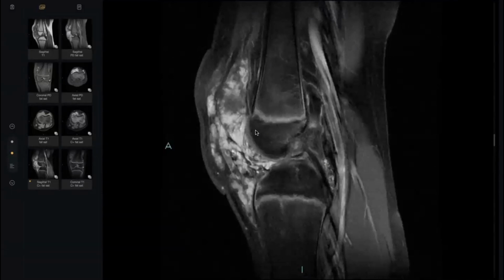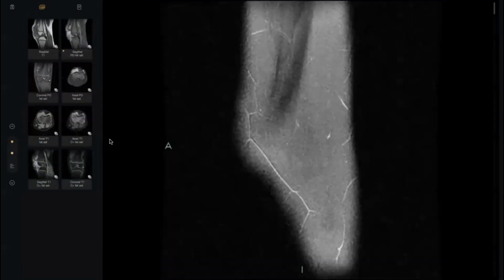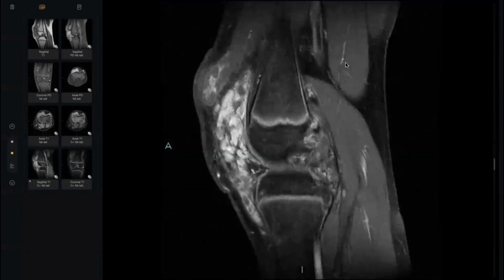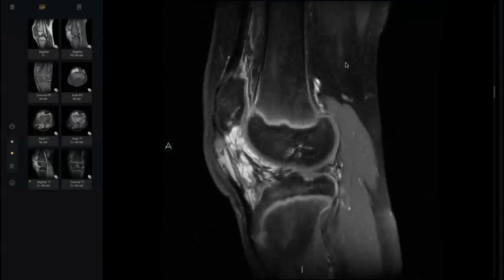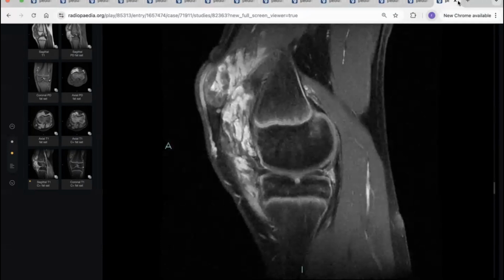This is not osteochondromatosis, because in osteochondromatosis you should see many innumerable loose bodies on the X-ray. This is mainly a soft tissue mass lesion. If you told me about pigmented villonodular synovitis, it would be acceptable, but I think PVNS will not enhance like this. This is an avid enhancer.